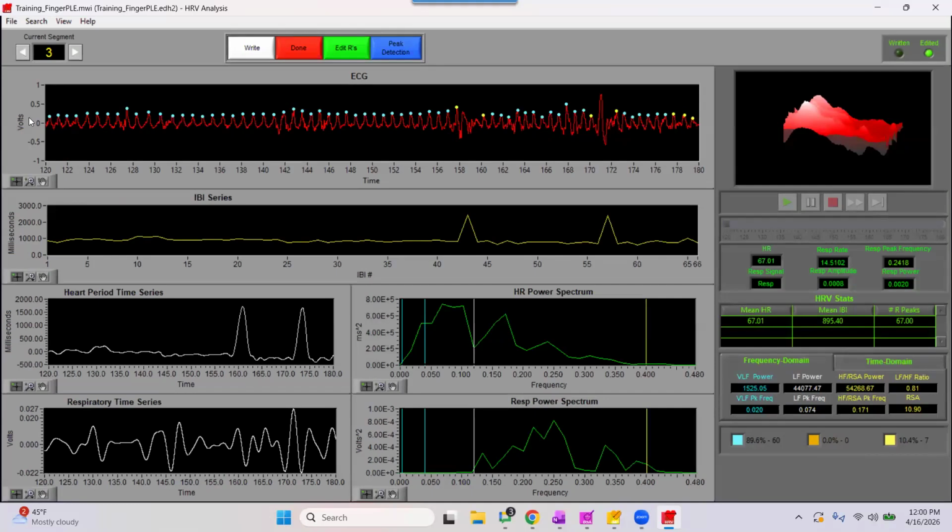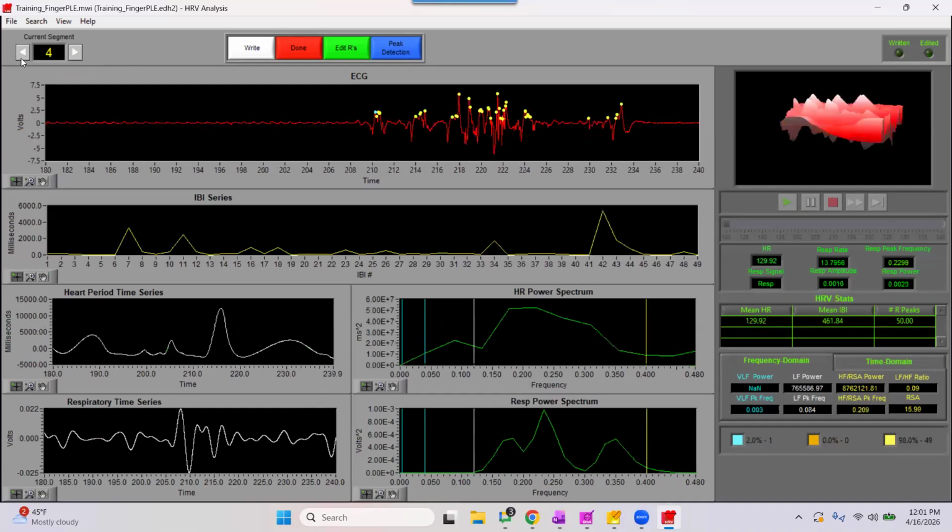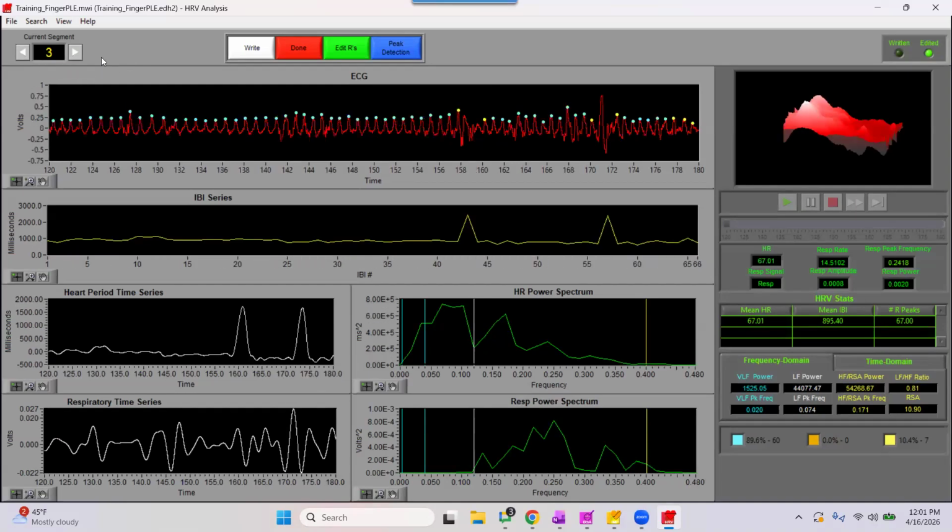So generally, if we have enough good segments and good cycles that have definition, we can definitely still use these participants with point inserts and midbeats around movements or points that lack definition for us. However, if we find that this is characteristic of the majority of the file or the majority of this participant, it may be someone that we don't include in final analysis of that segment, or final analysis of that participant inclusion.